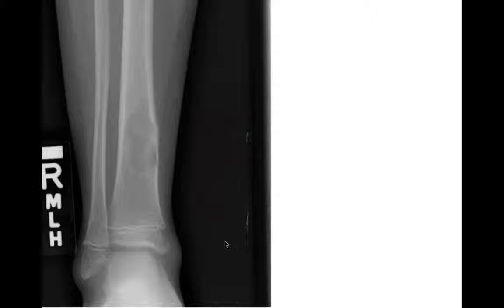They have a sclerotic border. They're common in kids. They'll fill in over time. So really good for non-ossifying fibroma. Really not much else to consider as a differential in this case. Benign lesion, leave it alone unless it's fractured, in which case they'll get treated for the fracture, but the lesion itself doesn't need any further workup or follow-up. You don't need advanced imaging for this non-ossifying fibroma. Benign lesion, geographic 1A.